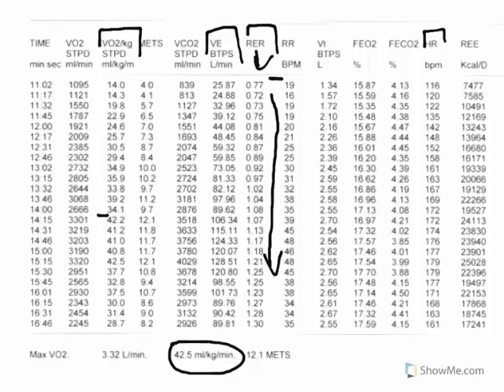The second thing that this can give us is if Curtis is an athlete and if he wants to do some sort of aerobic training for a marathon, triathlon, something like that, we can look and see where his ventilation threshold is. If you look here at this column, this is his ventilation. We see ventilation increases linearly with intensity. That's normal. What we want to look for is where does that linear increase become what we call curvilinear, where it spikes up. Most machines will have graphs, and this one does, that you can watch, and you can see where the spike of ventilation occurs.